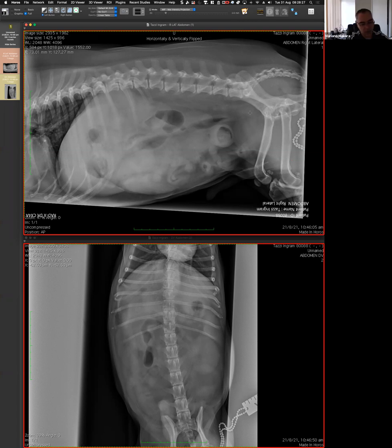I see, and I have no argument against that. What I'm probably saying is, be aware that you are getting into a tough ultrasonographic question, because you are dealing with the GI, and then you are trying to differentiate colon from small bowel. I'm not saying that you can't do that. Certainly you can, but you are getting into probably the most difficult aspect of abdominal ultrasound, which is dealing with the GI tract. Particularly with gas, hey?